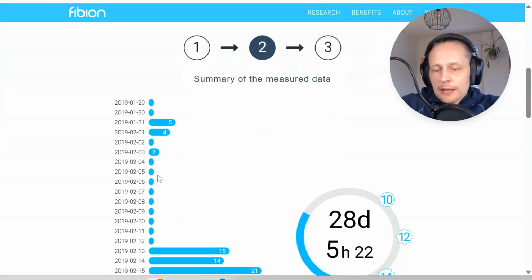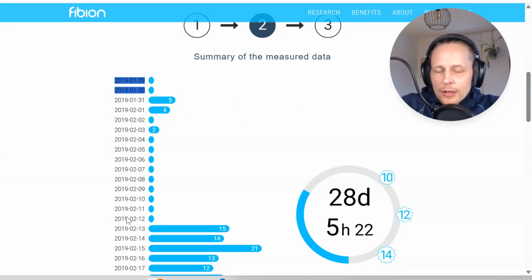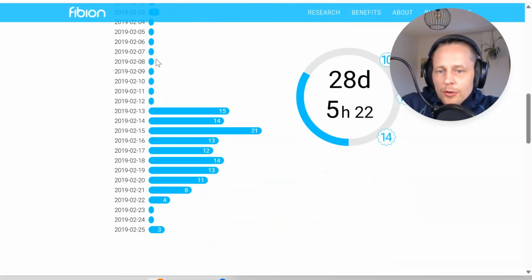And then, yeah, this one is an old data file from 2019, but it has data. So the measurement has been started here, and it has probably not been worn here. Maybe it's been in transit and it has recorded some movement, and then it has probably just been on a table or somewhere stationary and no data there.